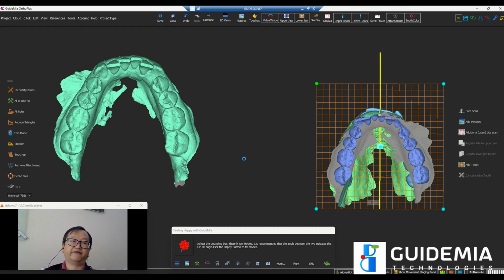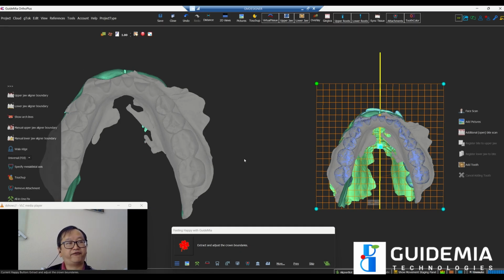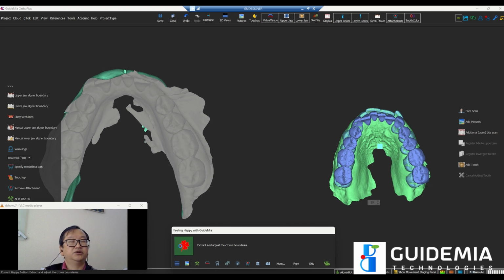As we have performed AI-based segmentation, we know where the tooth boundaries are, so we're going to generate a full contour of the crown area so that we can use that as our base for tooth segmentation refinement. At this moment, we are generating that. The model processing and fixing has been done.